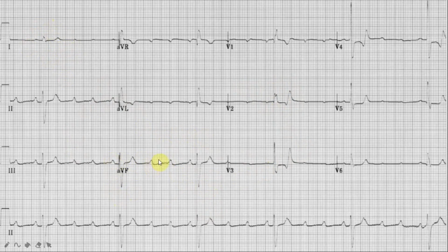The P wave is normal. The PR interval is constant, though there is nothing to compare to say if there is prolongation of the PR interval or not. There are regular non-conducted P waves. In this ECG, we have one QRS complex for every 4 P waves. Therefore, there is a 4:1 second-degree heart block. It can be quite challenging to say whether this is Mobitz type 1 or Mobitz type 2 simply by looking at the ECG. An electrophysiology study may be useful to come to a conclusion.